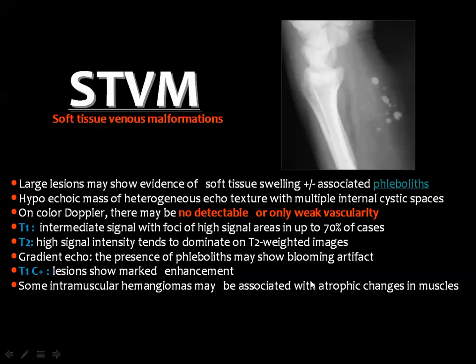As I mentioned before, one of the best diagnostic criteria of the hemangioma is to see calcified phleboliths in the soft tissues where the hemangioma is present. And this is a very important value of the plain X-ray. So if you remember in the first part of these lectures, I said that the plain X-ray, although it looks of little significance, sometimes will provide important information, very helpful for the diagnosis. When you see calcified phleboliths, then you know that you are dealing with a hemangioma.